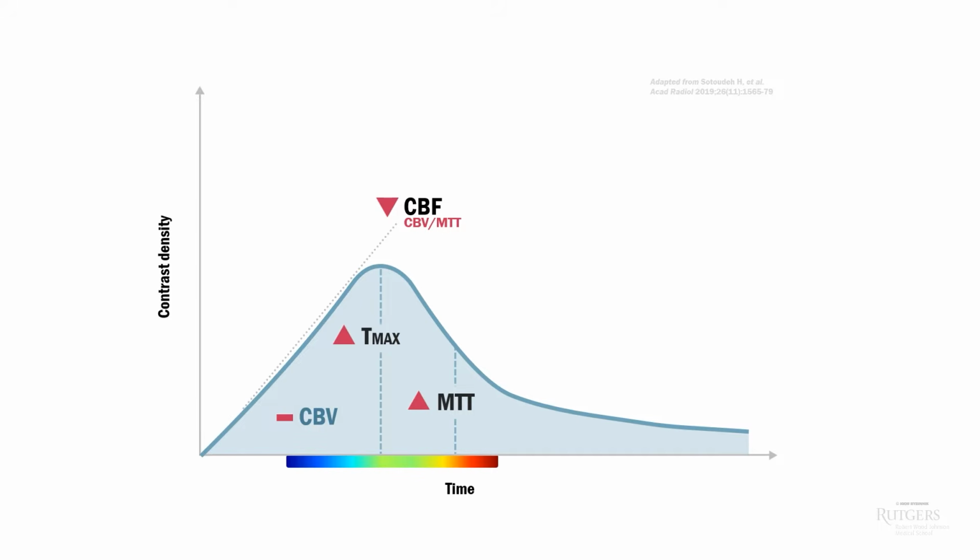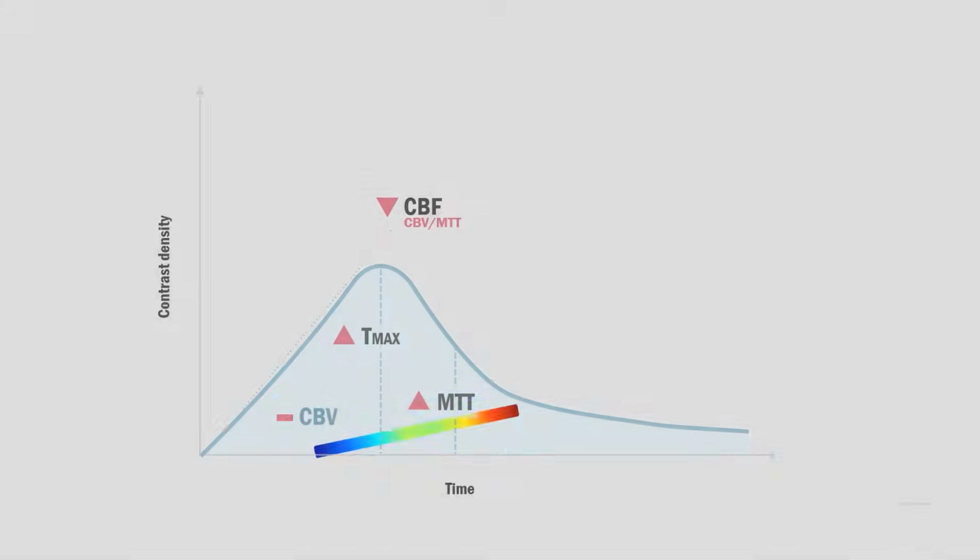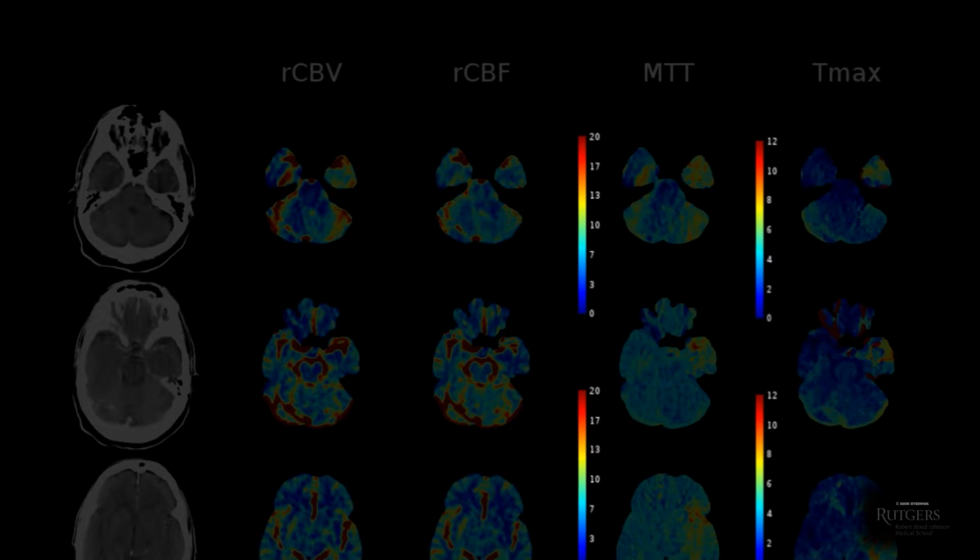Again, CT perfusion doesn't actually measure absolute blood flow or ischemic changes like MRI does. We use CTP abnormalities as a surrogate marker of tissue hypoperfusion. This will become important when we talk about CTP's pitfalls and limitations. Back to the image columns. Note the color scale. Lower values are in blue, intermediate values are in green-yellow, and high values are in red.